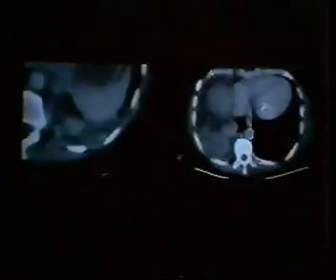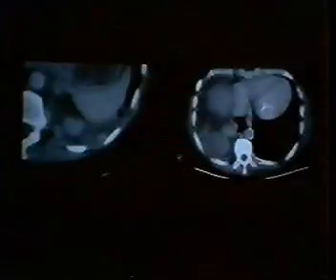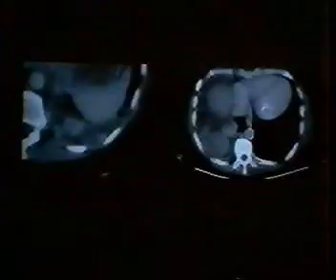Over the course of a year it went away. Clinically their impression was that this was a big pleural hemorrhage, and these were probably just areas of clot sitting in the pleura. So one thing that's been suggested to me by other people who have seen this case is sometimes when you see something like this, you might want to consider getting decubitus scans, because the implants of pleural metastatic disease are not going to move around. Large blood clots may well flop from side to side when you change the position of the scanning.